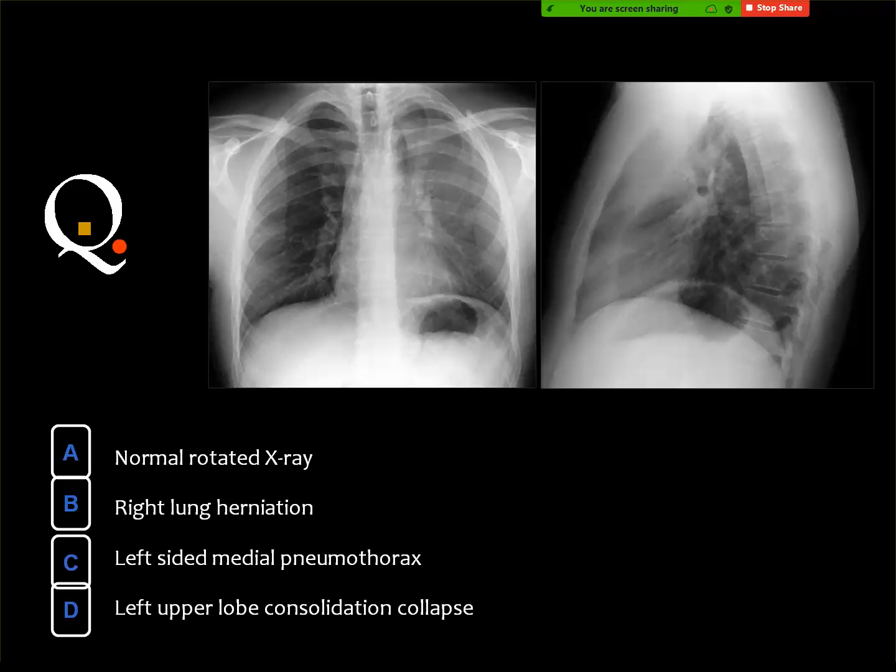Actually, this is to my mind somewhat difficult, but if you see the lesions in the plain X-ray, you should favor the possibility of contusion more than COVID opacities, because the COVID opacities are at the level of ground glass, and they are not clearly seen in the chest X-ray. Also, if you can see fractures of the ribs, this is in favor of contusion.